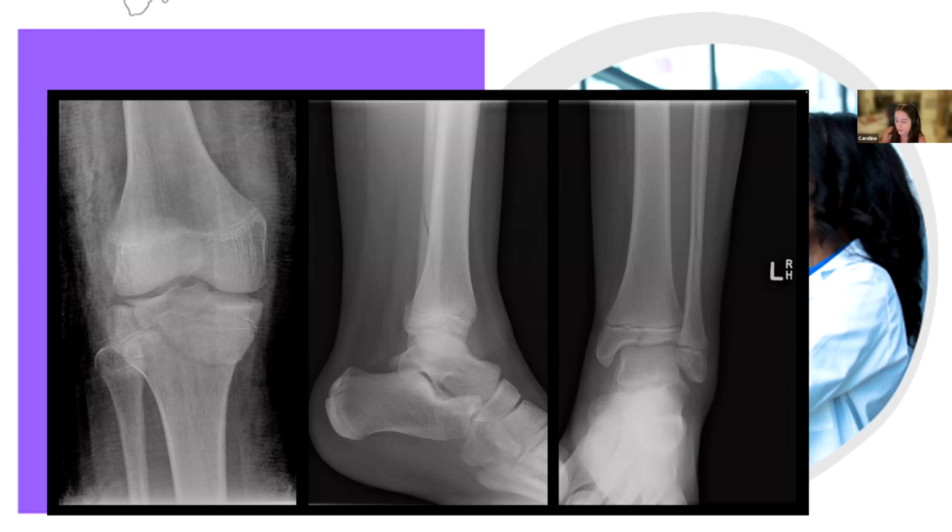So we have adolescents who are starting to close their physis, and it closes from medial to lateral. In that time in which the medial aspect has closed but the lateral aspect is still open, if you have an injury, this open physis in the lateral aspect is very prone to this type of fracture, the triplane fracture.